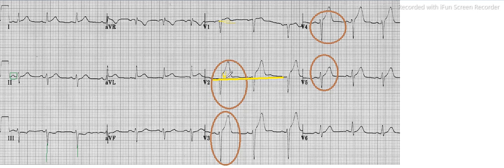But in lead V2 and especially in lead V3, if you draw the isoelectric line here, and lead V4 also, and similarly in lead V5, you see that the ST segment elevation can be seen. In V6, it is normal, so there is no ST segment elevation.